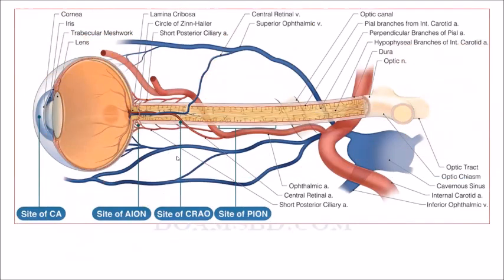It's a very nice picture. Is the central retinal artery occluded? Which one is the central retinal artery? This is the ophthalmic artery. From here, the central retinal artery arises, and this is the central retinal artery. It gives the blood supply to most of the retina. It is blocked somewhere by a clot or something. But there is another small vessel, you look at.